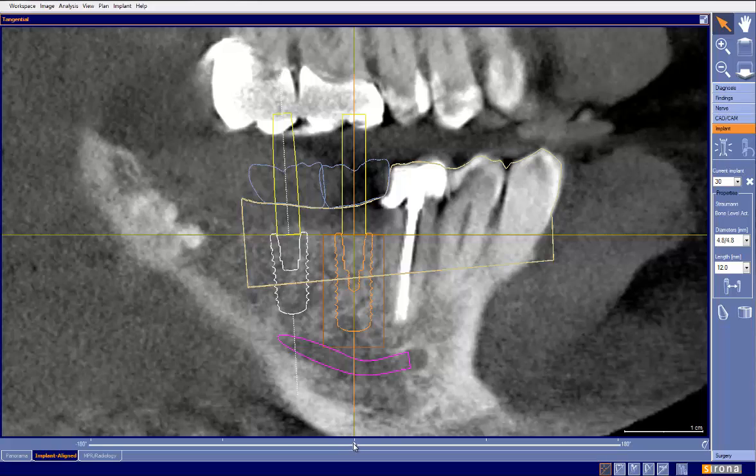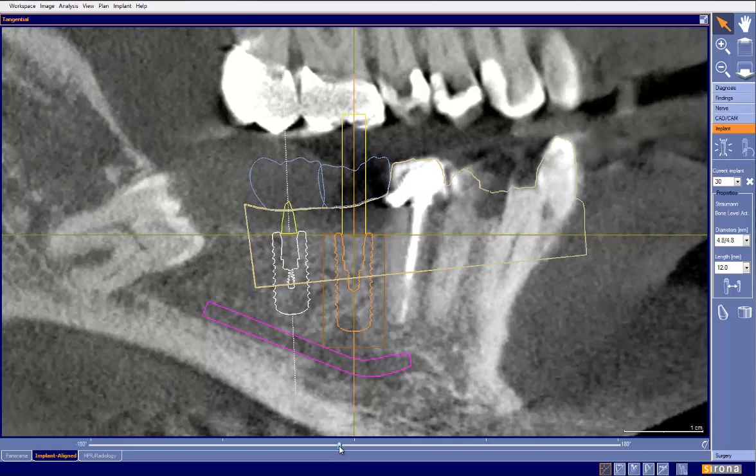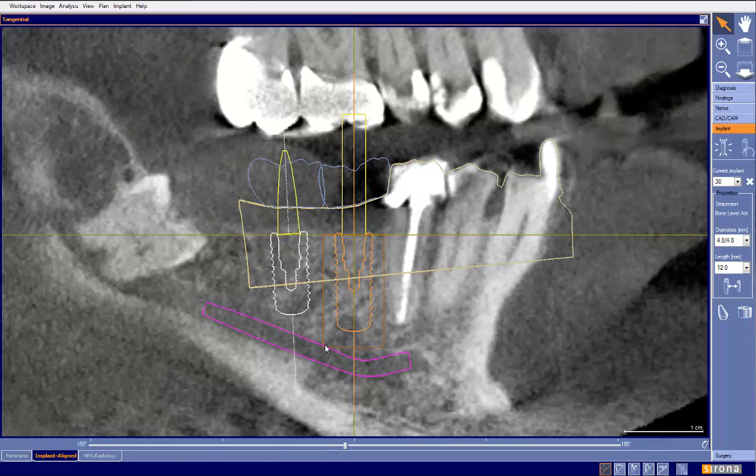Okay, and when I go in my 360 view and move around here, I'm left to believe that the nerve may actually be right in here. So, we can see that it's clearly right here, and then I might believe that the nerve is actually right there. Okay, so, when I see this, we have plenty of space here.